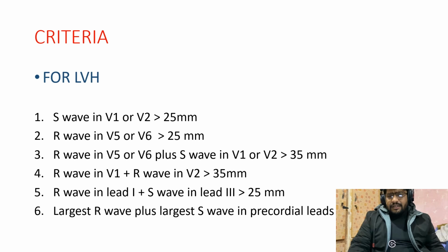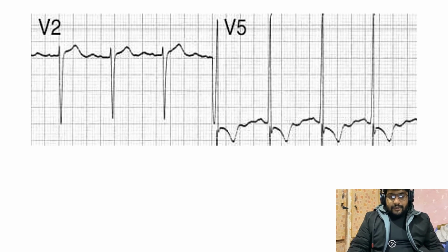You should take a screenshot of this slide so that you can always come back to it and revise it. All right, let us just look at some examples of left ventricular hypertrophy.